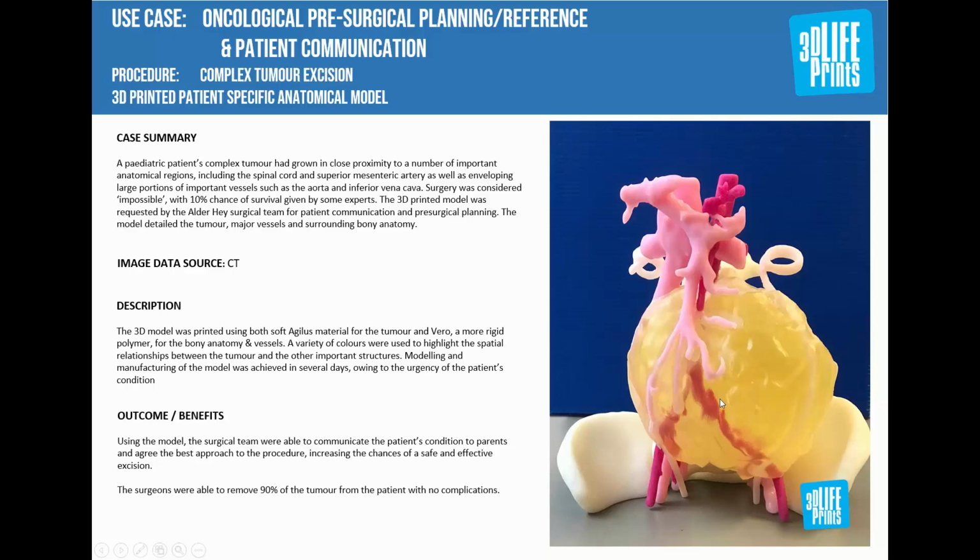And you can actually see it's also semi-translucent, and you could make out the pathway of the vasculature, in this case, through the tumor. So this was able to give a sense of depth, give the ability to actually start to cut in and practice any potential resections on this tumor, while also being able to visualize the anatomy through the tumorous mass.